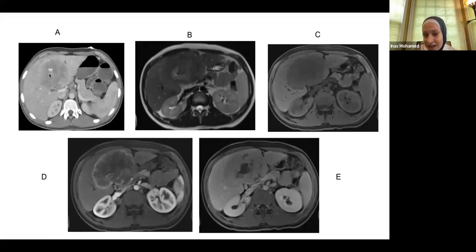Hemangiomas don't have calcifications, and this is just very aggressive for a hemangioma. I understand sometimes a giant hemangioma can be an issue too, but with this signal and the way the necrotic scar looks, this is not really a hemangioma. It just looks malignant. I would understand why somebody would say cholangiocarcinoma, but benign hemangioma doesn't fit.